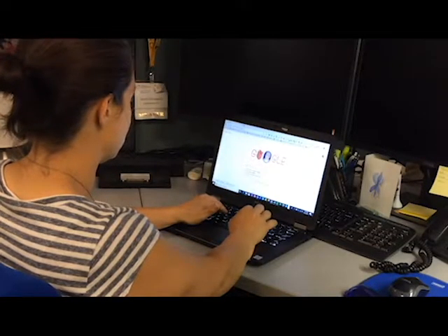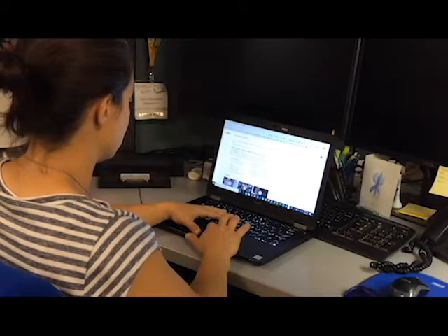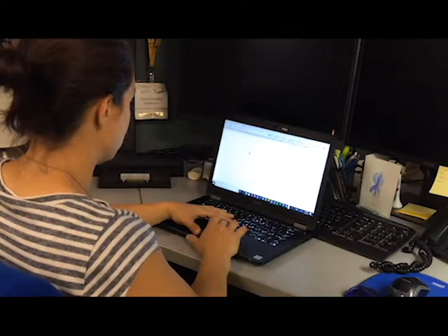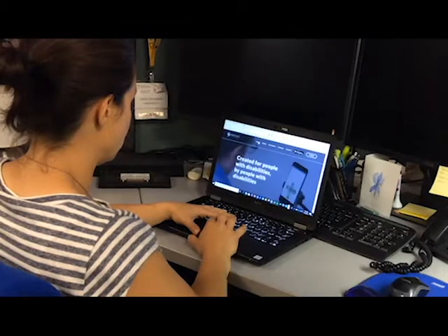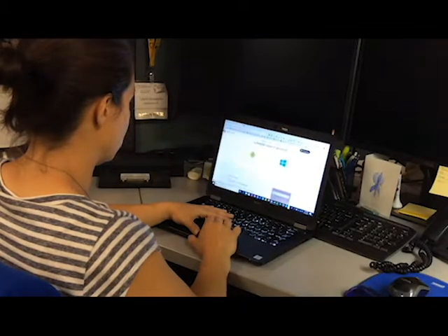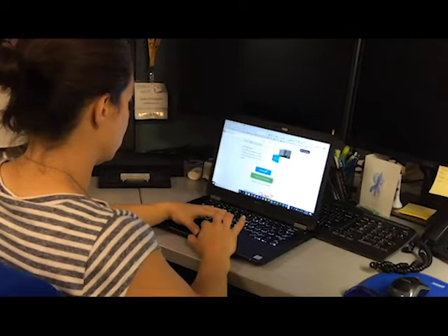Open Sesame for Windows is a new software that allows people who cannot use their hands the ability to control their computer with head movements. To download the software, visit Sesame Enabled's website. You can try the software for a limited period of time for free to see if it fits your needs prior to buying the lifetime license.